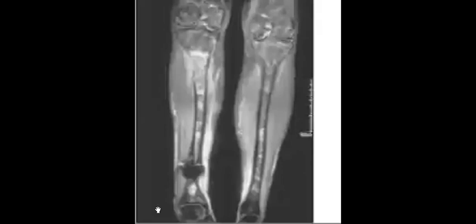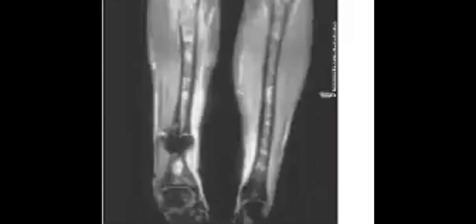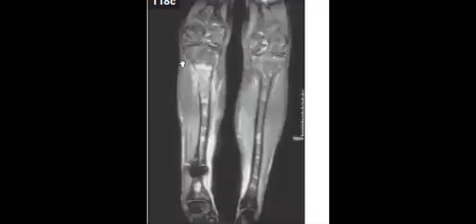Multiple infiltrative marrow lesions. Yes. So with cortical disruption and some edema at the adjacent muscles. Yeah, so this is the most important to mention. Again, destruction reaching the cortex as here. Wide zone of transition again. So perfect explanation, yes, Fawzi and Marwa, Shayma, yes.